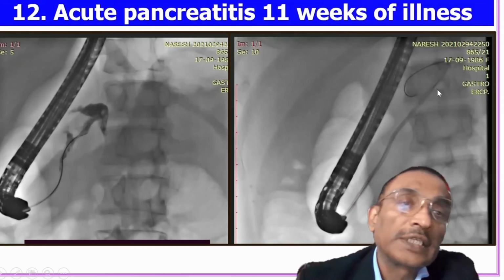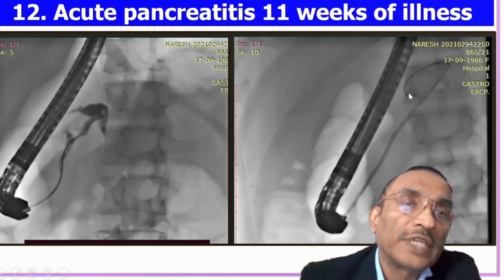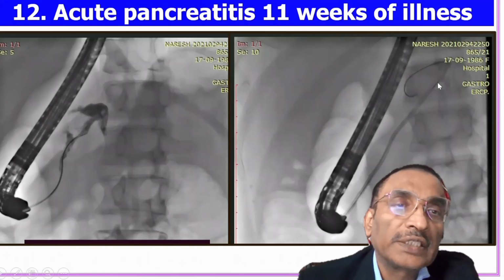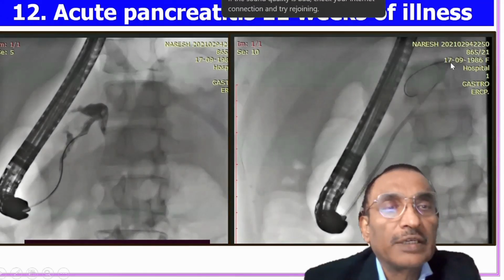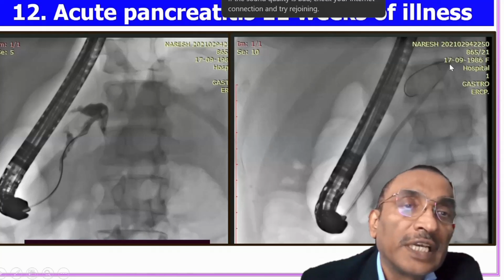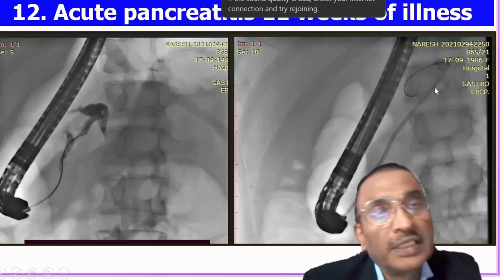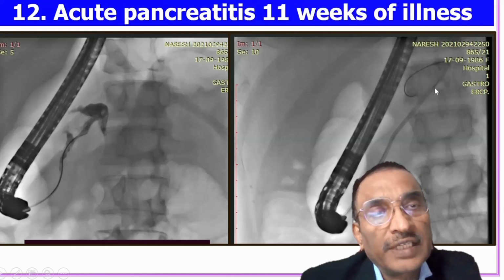I am trying to point out that whenever you try to do stenting, you see this guide wire, VisiGlide, and in the VisiGlide the tip will be very radiopaque. The same is true about HydraJag also, and then the highly radiopaque tip is finishing here. But you see another very dense radiopaque marker out here. So what does this signify? It signifies that beyond that, the wire is tapering and becomes floppy.